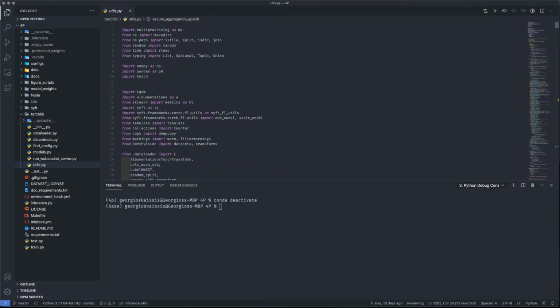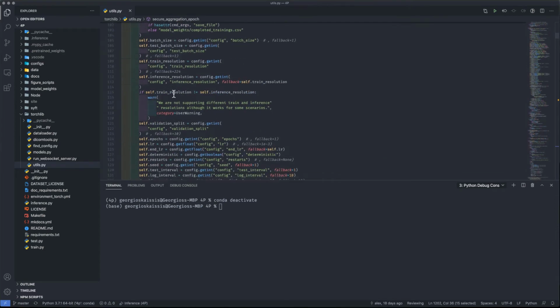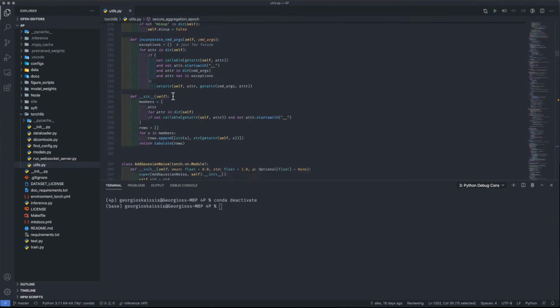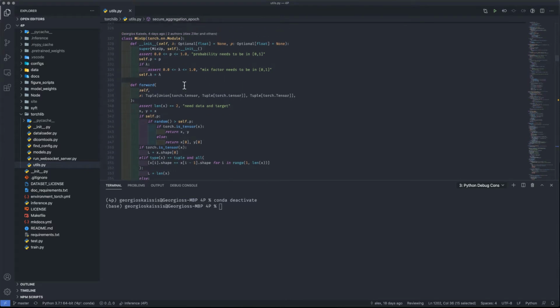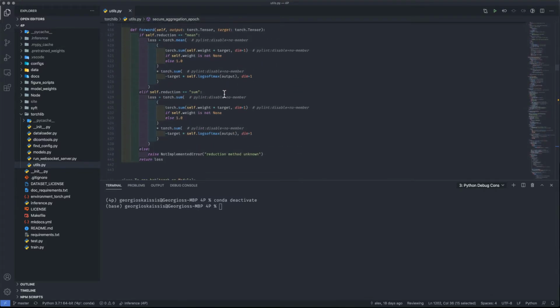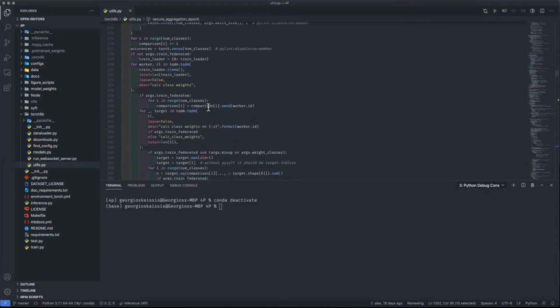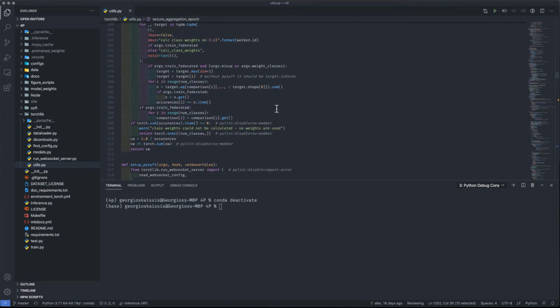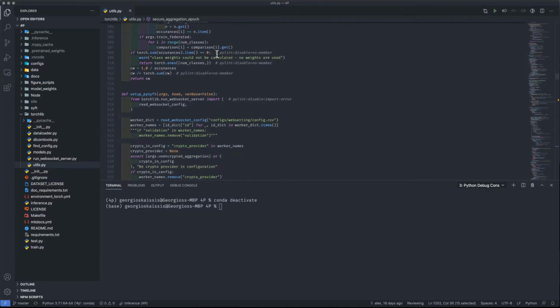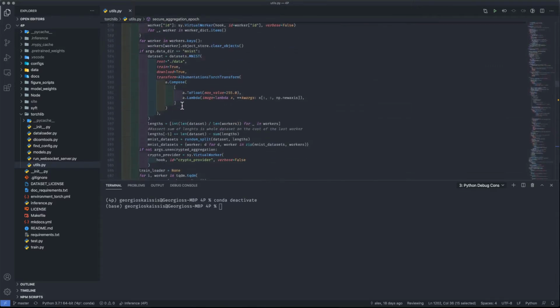Utils, this is really like the 10-ton hammer here. This contains basically all of the logic. So there's stuff for learning rate scheduling. There's namespaces with all the arguments. There's a lot of stuff for augmentation, mixup, for example, which we have implemented as an augmentation technique. There's modified versions of various loss functions to work with Mixup, for example, we've got facilities for doing federated, class-weighted averaging, also class-weighted gradient descent. There's stuff for turning on and firing up PySyft.